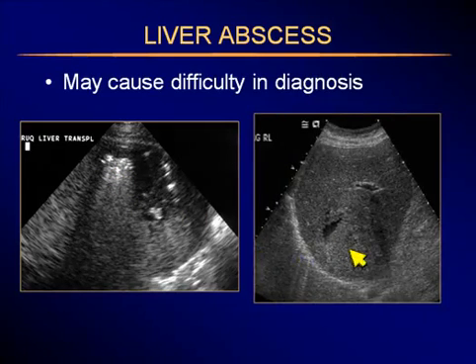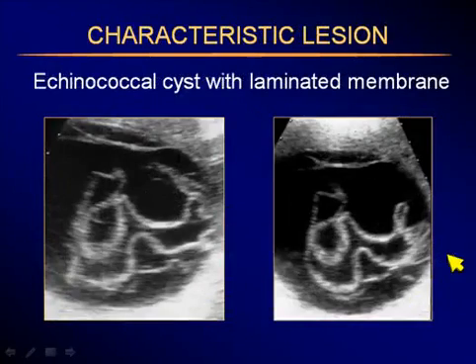that sometimes may shadow out the back wall of the abscess itself and may cause confusion in its appearance. Here's another way that an abscess can confuse us. An abscess completely filled with pus can be echogenic and sometimes look isoechoic with the liver, and it may actually mimic liver and you may not recognize it. But your eye then would catch some effect on a vessel. Perhaps you may catch an edge effect from the curved surface, and you would eventually realize that there is an abscess here within the liver.